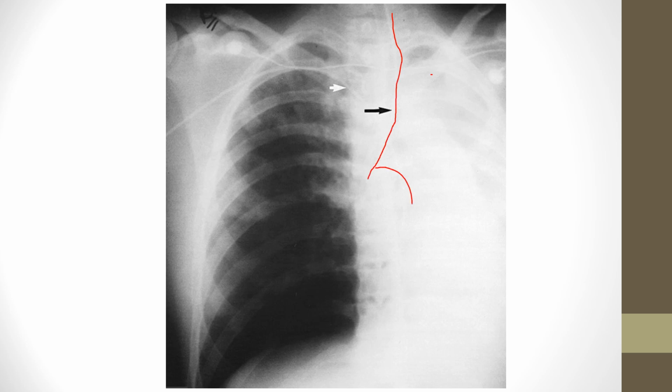Does that look like it goes past the carina here? Yeah, it goes past it. So what do you think is going on? Obviously ventilator-induced lung injury. Hyperinflation of that one side, destroying lung tissue. You should always be like, foul, foul, right?